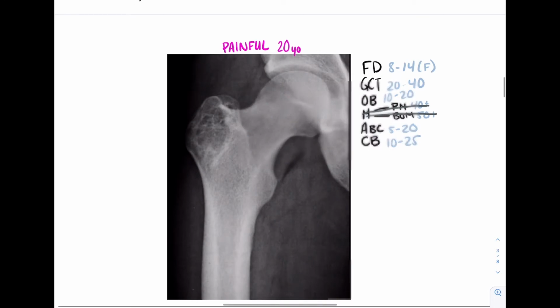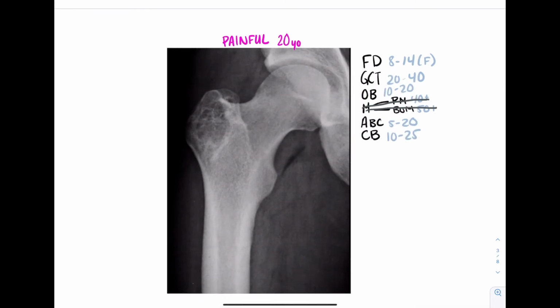Okay, now from there, we already talked about fibrous dysplasia. Fibrous dysplasia kind of looks like everything. So it's always at the bottom of my list. But the only time it's at the top of my list is if it really looks like a long lesion, a long bone. And does it look like a long lesion, a long bone? No. So it's probably not going to be on my differential. So I'm not really thinking about it too much right now. Okay, it doesn't trigger me yet.